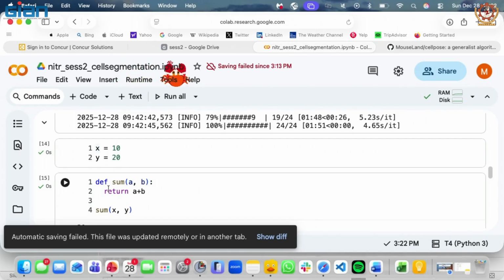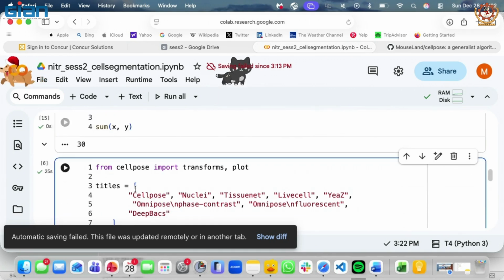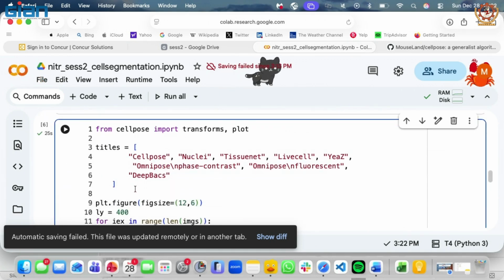So this is the problem of this cell and kernel setup. It's called a Jupyter or kernel based compiler. If you are working on inline compilers, that means you write the full code in a python .py file and run that file, you'll not have that error. It's just that you might misreference something in this Jupyter lab or Jupyter notebook setting. Okay, any other question for cell segmentation?